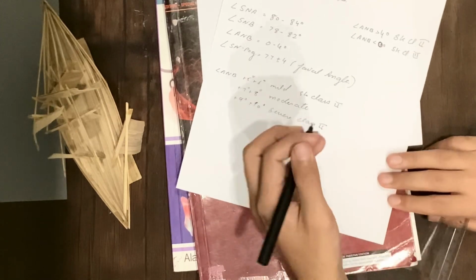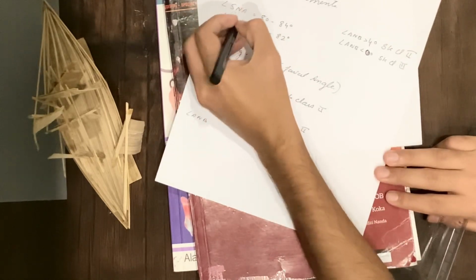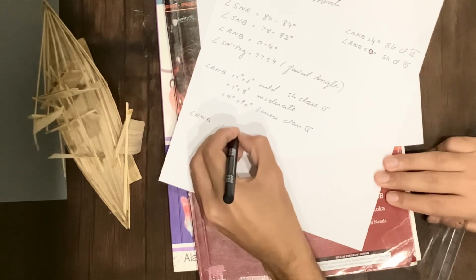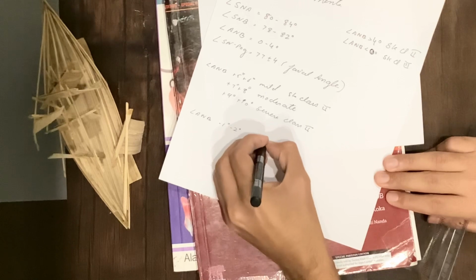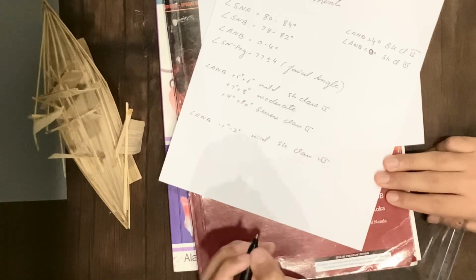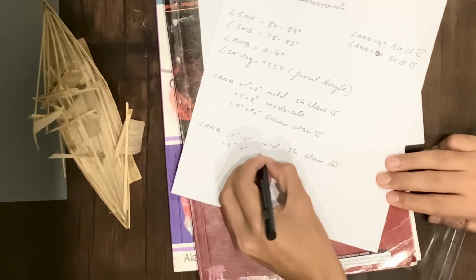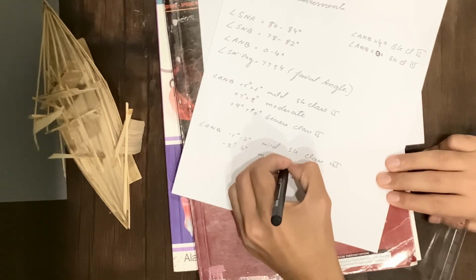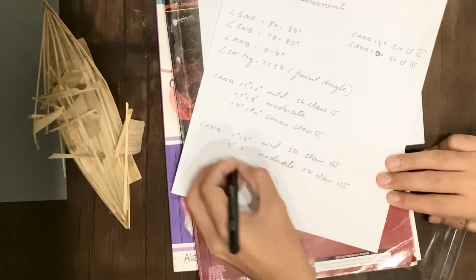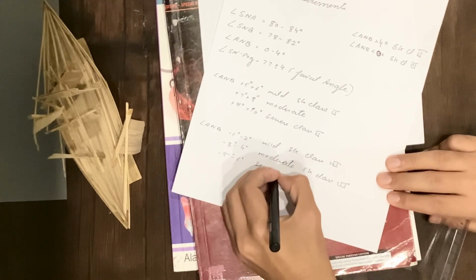Vice versa, if the ANB angle, which is the difference between SNA and SNB, is between -1 to -2 degrees, then it is a mild case of skeletal class 3. If it is between -3 to -4 degrees, then it is a moderate form of skeletal class 3. And if it is between -5 to -6 degrees, then it is a severe form of skeletal class 3.